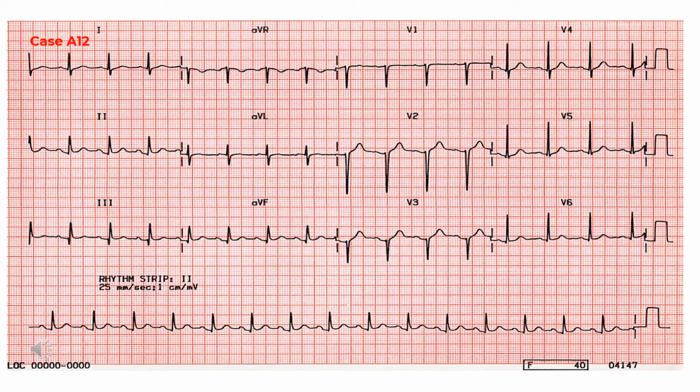The apparent Q wave in lead 3 is in fact an S wave, as there is a small R wave recorded before this, the QRS complex being an RSR complex in this lead. The Q wave in lead aVF is not pathological, being less than 0.04 seconds and less than 25% of the height of the following R wave.